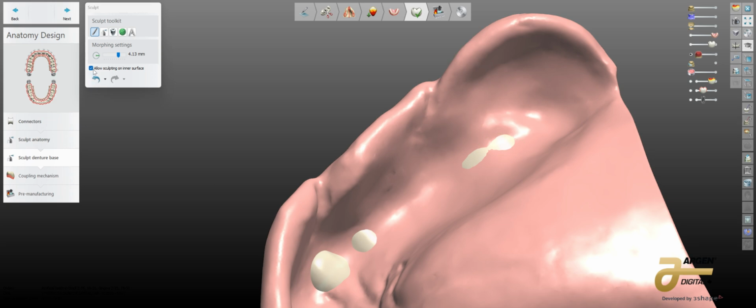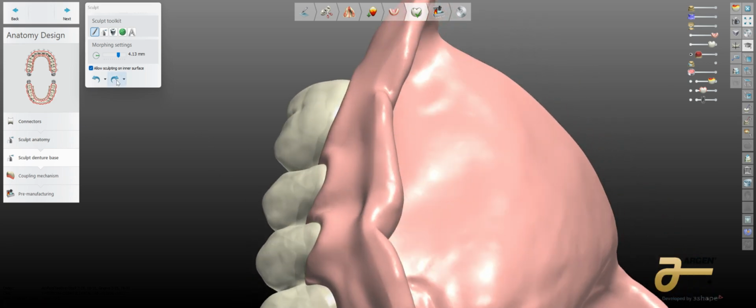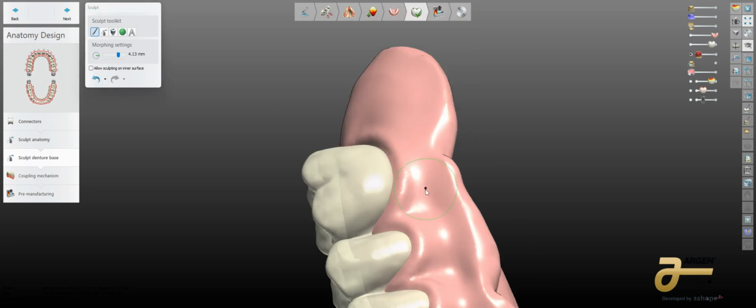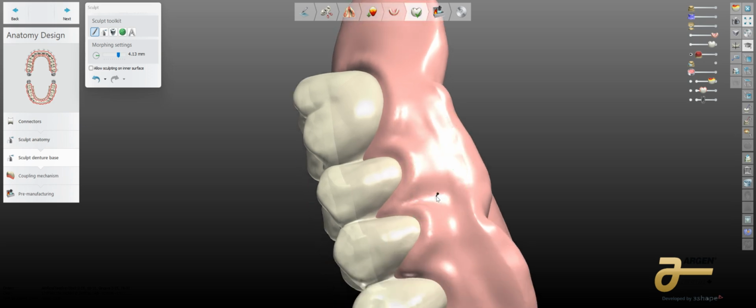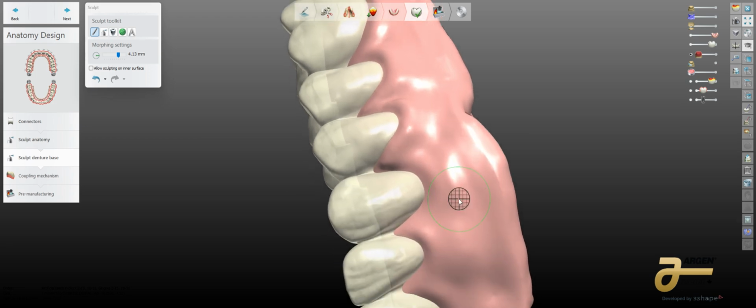So remember, after you smooth that border, let's just go ahead and I'm going to right click and Control Z again and remove all that. See how I distorted a little bit on the inside there from when I was using the tweezer tool? So remember, once you do that smooth aspect of it, let's go ahead and take that off, and then it's going to protect the internal. So those little things like that happen often. If you don't remember about that, you always have the undo tool to go back, which is super powerful.